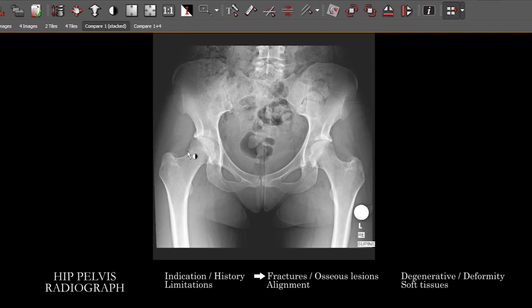Okay, we're not just looking at the femur. You're going to take a look at the iliopectineal line, the ilioischial line. We're going to trace the entire osseous pelvis and look for subtle cortical irregularity, displacement of the pubic symphysis or the pubic rami. You're going to trace the sacral foramina. You're going to look along the sacroiliac joints and at the lower lumbar spine.